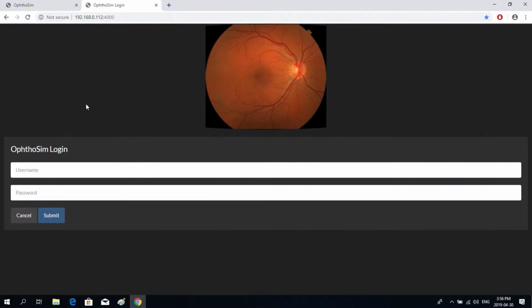In this section of the OphthoSim video software learning, we will show you the portal side of things. So this is the Educators Portal. It allows the instructor to select a curriculum for their class and define their class, and allows them to set exams or quizzes delivered for a particular student or for a particular class.